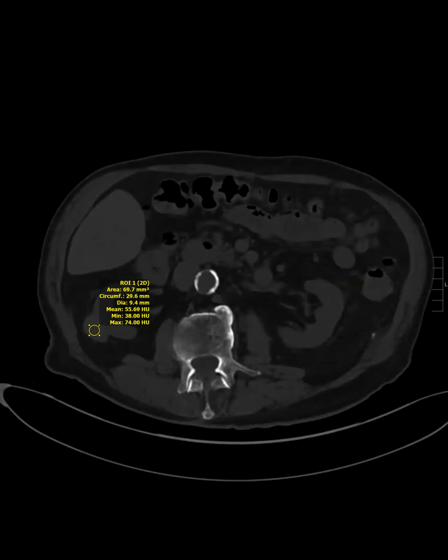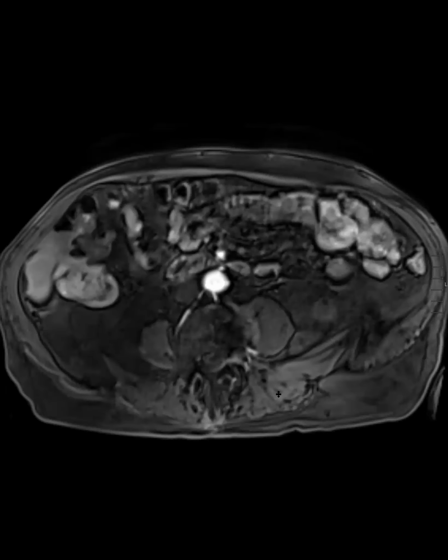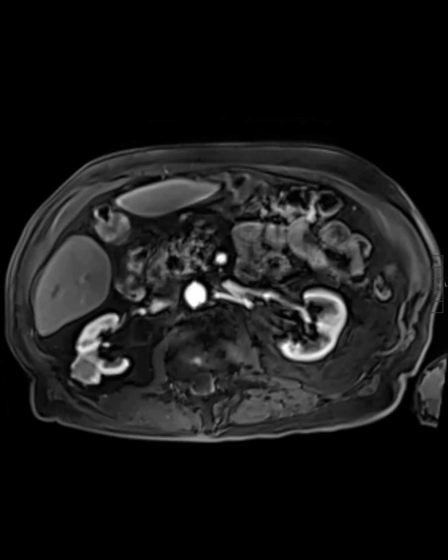And it was growing. Once it reached over 3 centimeters, they decided to ablate it, and they did an ablation biopsy, and this came back as clear cell, grade 2. So the teaching point, as Steve referred to, is you just don't know. You can read the book and then still turn out to be clear cell. By the time this one's getting bigger, it looks a little bit more ugly and suspicious. Yes, and then we started to have restricted diffusion too, which we didn't have before.